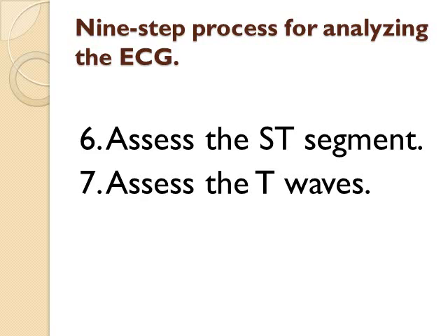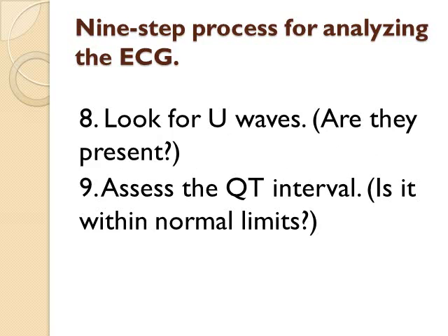Assess the T waves. Is it slightly asymmetrical? Is it of normal height? Is it oriented in the same direction as the preceding QRS complex? Look for U waves and assess the QT interval.